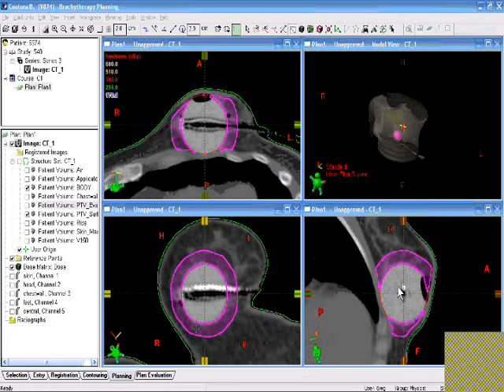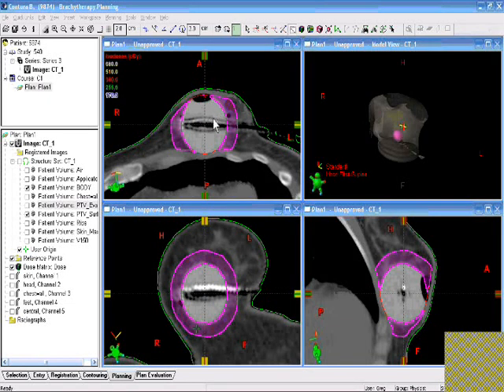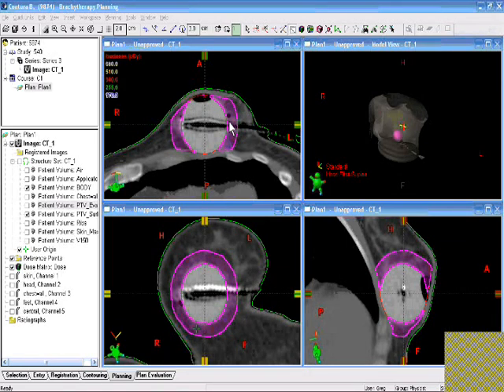So just to keep that in mind, that there are clinical issues here aside from just the treatment planning in particular. In addition to that, in this particular case, you can see, unlike the other case, we have truncated the PTV for evaluation in this region. And so we won't be able to calculate the V150 and the V200 accurately in this region if we evaluate them on the PTV eval.